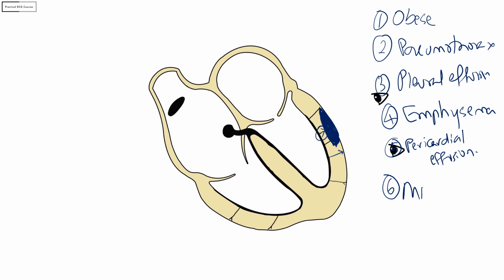In addition, suppose a patient has an infiltrative disease such as amyloidosis or sarcoidosis or hemochromatosis. Again, these can all cause small vectors for the same reason as what we have seen earlier. See, the size of the vector is decreased. Again here it is decreased. Again here it is decreased.